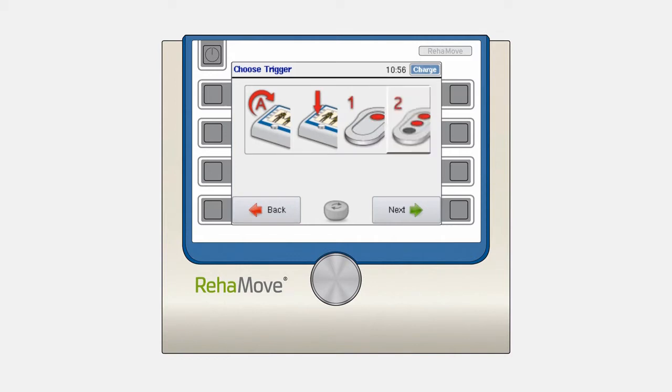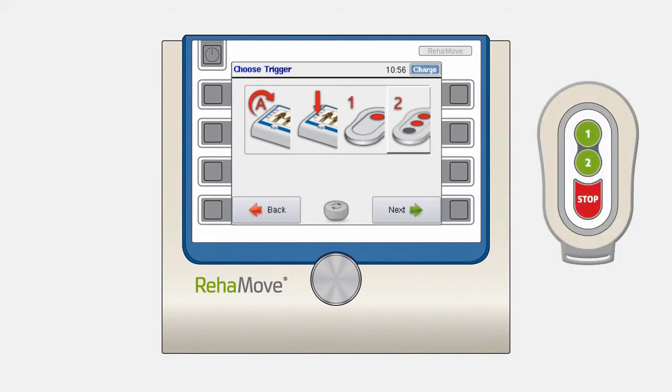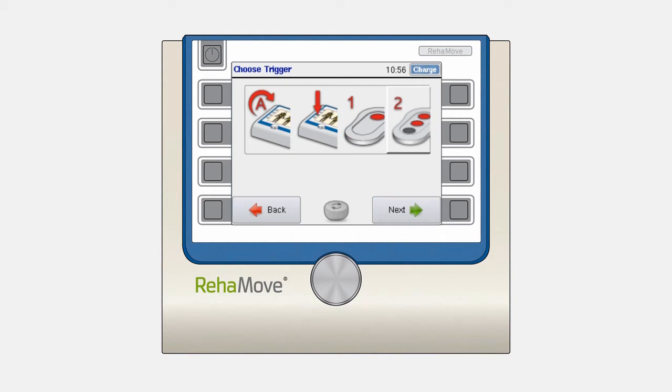You also had the option to choose different equipment related to your external trigger selection. You could either use an external single trigger or an external double trigger as hardware. For further information regarding sequence training applications, please see our video tutorial, Sequence Training Overview, for an example of sequence training applications.